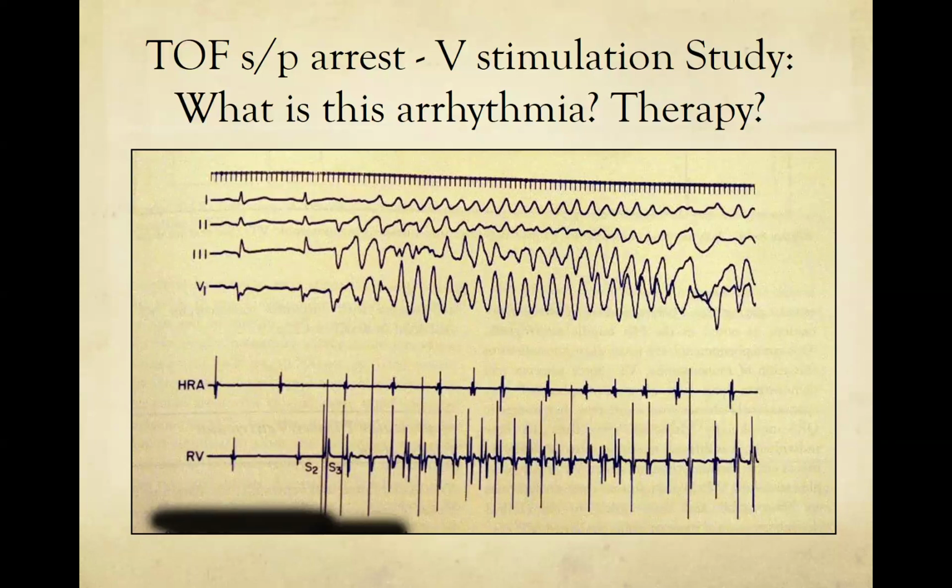All right, morning, Dr. Pass. Okay, so it looks initially like probably a sinus rhythm, not perfectly clear. And just then, let me be clear, because this is a really strange looking tracing, right? But this is two extra stimuli, S2 and S3, in the ventricle, just so you know. I know it doesn't really look like the usual tracings that we see, and it also has no lines on it. Trying to make it as completely crazy as possible.